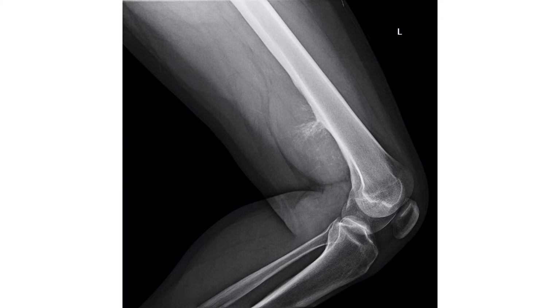So we have a matrix producing tumor. You have three different versions of matrix. You can have osteoid matrix, you can have cartilaginous matrix, or ground glass matrix. So in this case, we have actually some osteoid matrix because it looks like it's trying to form actual bone within the lesion. The other thing I want you to notice is we have a soft tissue mass associated with it, and then there's this kind of stalk of bone production along that appears to contact the posterior cortex. There's not really any cortical destruction, and there's nothing actually in the femoral medullary cavity, it doesn't look like.